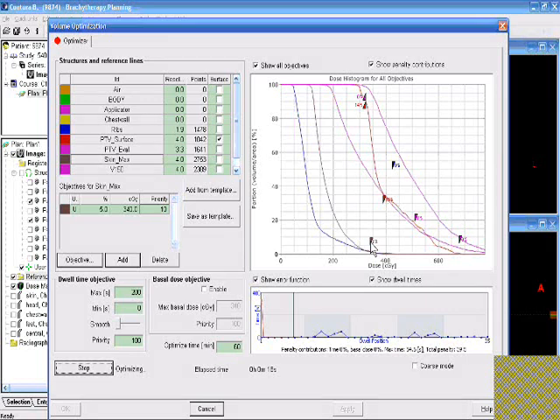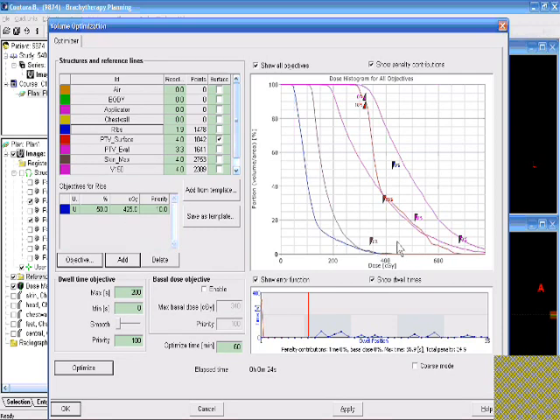We have the skin and the rib dose here. We'd like to hold them near this region. I think that I made one of those wrong. Let's check. The rib dose is 425, and I don't see it here. Unless I set it way down to that 5%. There we go. And you can see that the rib dose is easily met here. The skin dose one, which is this brown line, is not being met exactly, but it's up here somewhere, more like 100%, 120%, something like that.